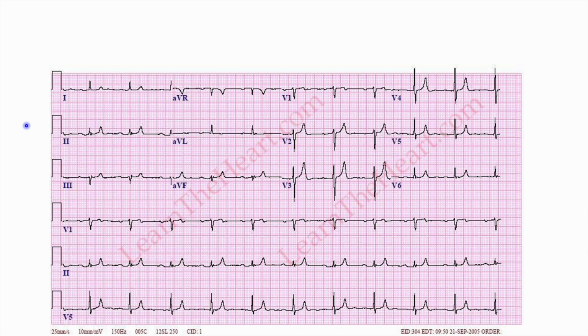Three, 2, 1. This is an example of hyperkalemia. Electrolyte imbalances can often disturb the heart, especially with potassium, and that can be shown in the EKG. Examinations will typically only test potassium, so that's all I'm showing here. With hyperkalemia, you want to look for spiked T waves. If you have a lot of potassium, you're going to have a really big T wave, and that's the main thing that I look for.